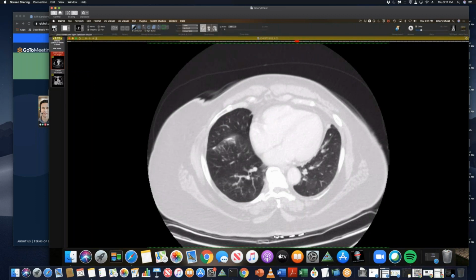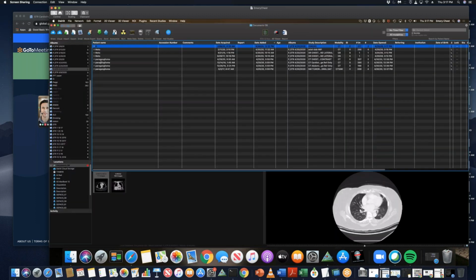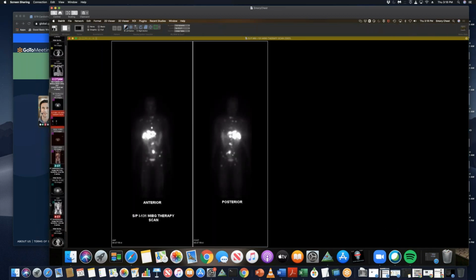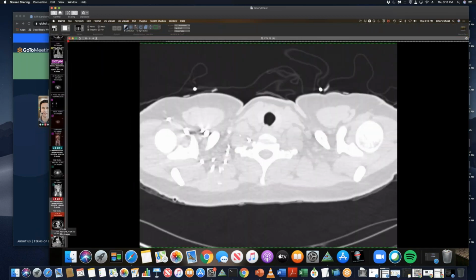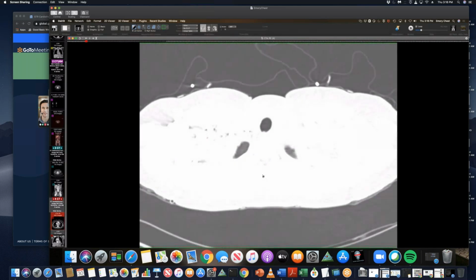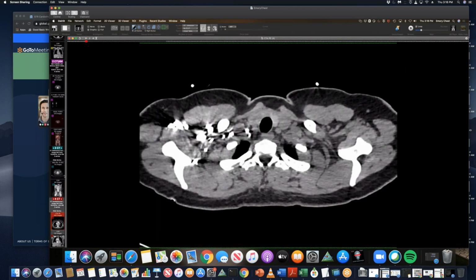So DIPNECH, and then I'm going to show a companion case that I read yesterday, kind of similar but different. So this patient, I read a chest CT on this patient yesterday, but I'm going to start off by showing the abdominal CT from 2016.